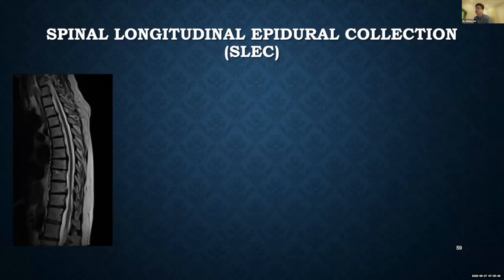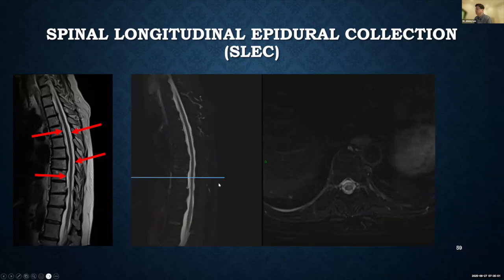So you can see a T2 sagittal of the spine. There's the thin ventral and dorsal epidural collection. On the fat sat sequence, same thing at this level here. You can see the ventral epidural collection. This is the dura here, the dark line, the thecal sac, and the dorsal. And this patient here has a lot of degenerative changes.